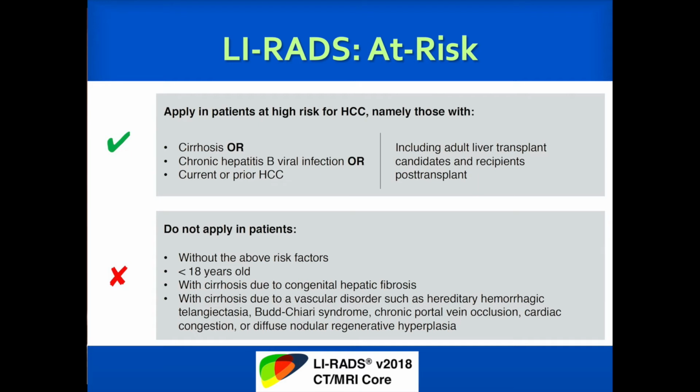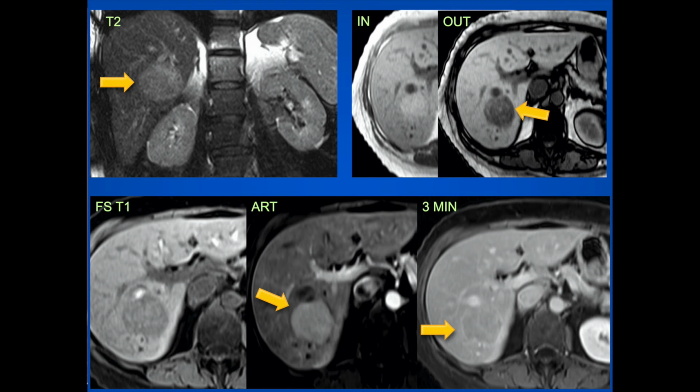And again, they may be at increased risk for HCC, but it's just not enough that we can have confidence that a LI-RADS 5 in these patients has a 95 or greater percent probability of HCC. Let's look at another case.